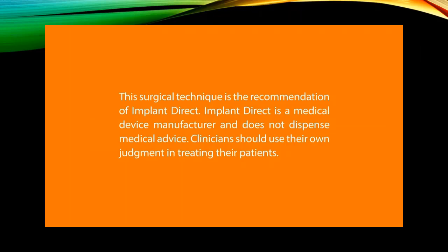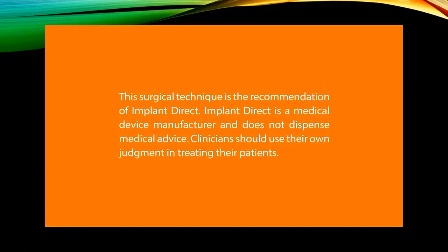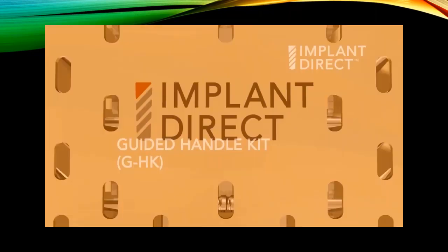I'm going to play a short video here that goes through that key kit. It's a little hard to fully understand the key kit by seeing a couple of slides, but this is a short video, a couple of minutes, that walks through this. Implant Direct has this available. And this will really help understand, put this visually as it goes.